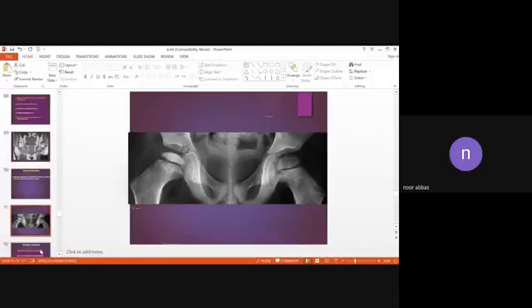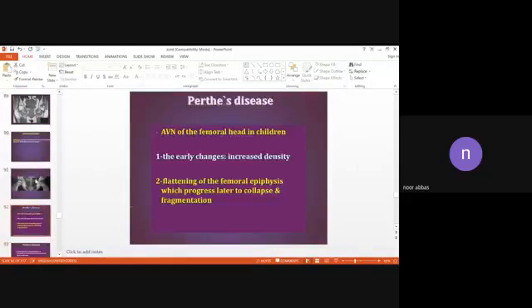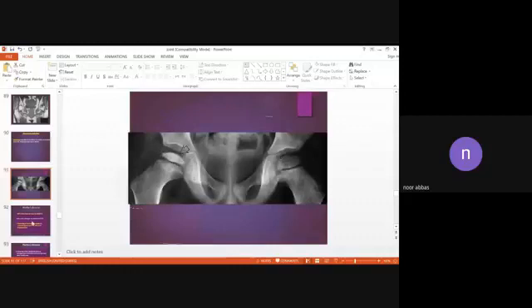Avascular necrosis can affect the adult skeleton. It can also affect the pediatric skeleton, but we have a different name for it. This time we don't call it just avascular necrosis. In the hip joint, involvement of the epiphyses by devitalization, or avascular necrosis, is termed Perthes disease. Here we notice a typical example of Perthes disease. This is the epiphysis of the right femur. It is flattened and dense, while the other epiphysis shows normal contour and normal height.